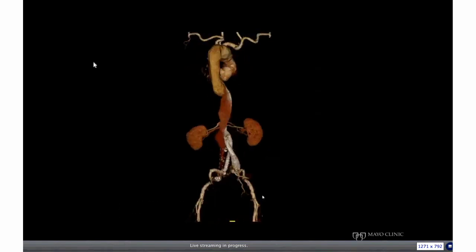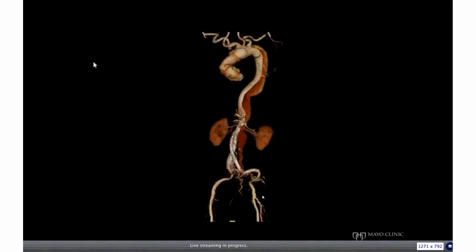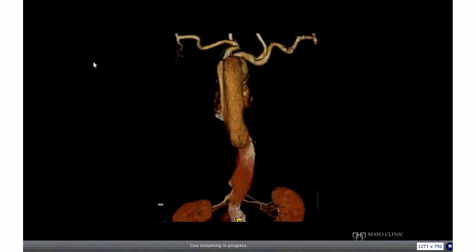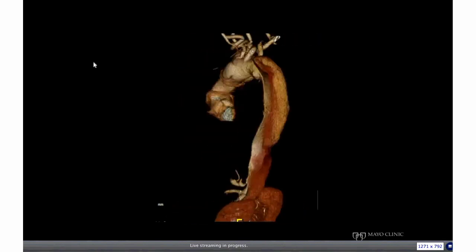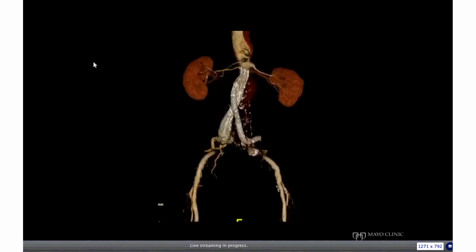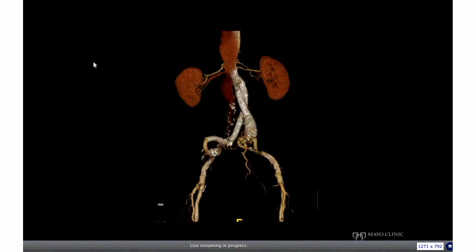As you can see in the proximal part, there is still involvement of the aortic arch by dissection and a small aneurysm. The dissection tracks across the renal mesenteric segment, the celiac axis, the SMA, two right-sided renal arteries, and a left-sided renal artery are involved by dissection.